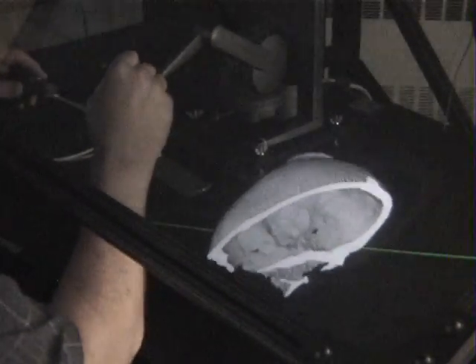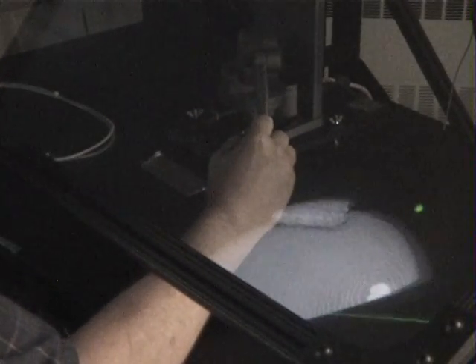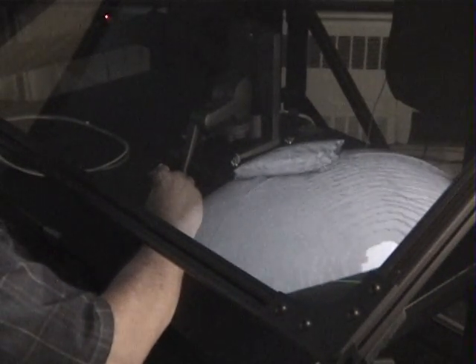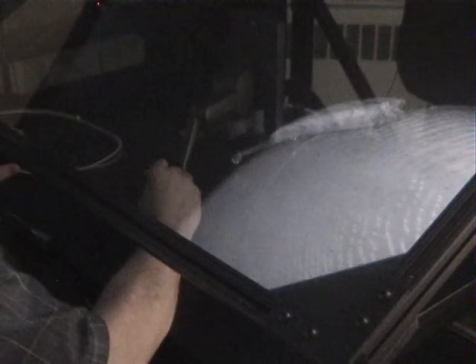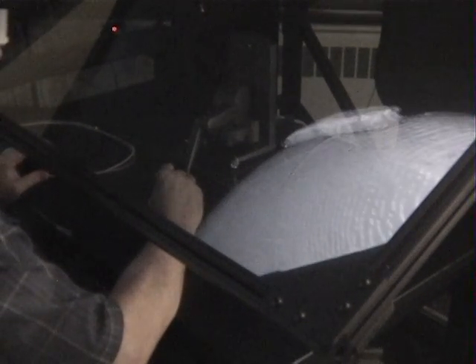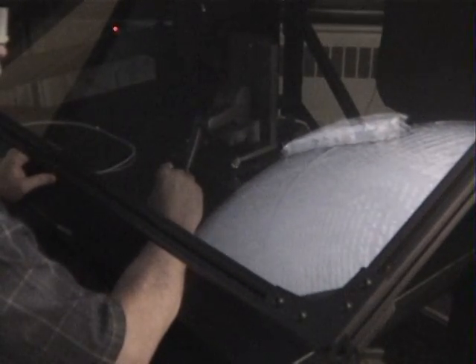And I can grab it, and you can see, I'll try to bring it up and enlarge it, that the implant has now been pushed free of the rest of the skull, and that would fit back into that defect in a very precise manner.